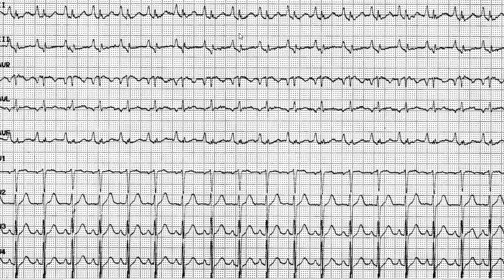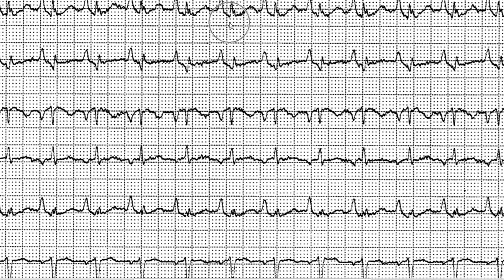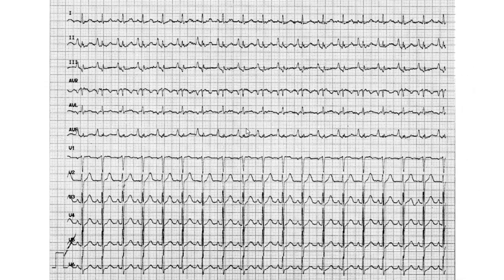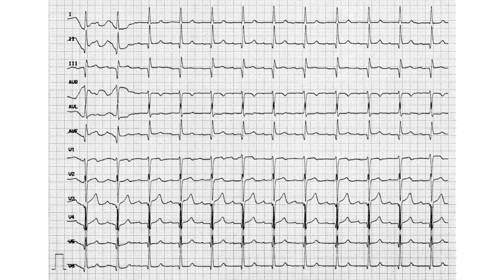And again, I wanted to highlight this example. Oh no, what are you talking about, man? There's clearly guys jiggling all over the place. No, again, so there's fibrillation here. No, look, 1. If you're going to tell me that it's fibrillation with frequency 1500, I'll tell you that is incorrect. Okay, so onwards. Next example is question 34 of the scripta.